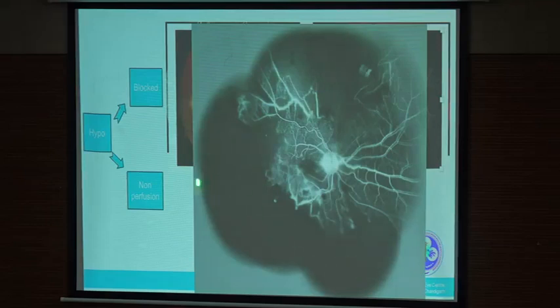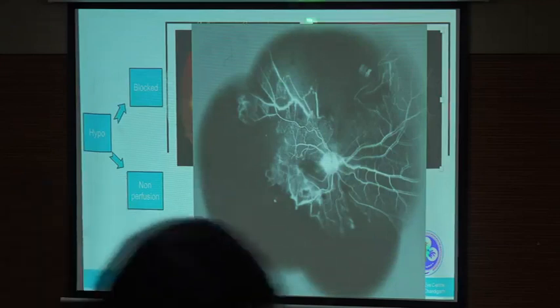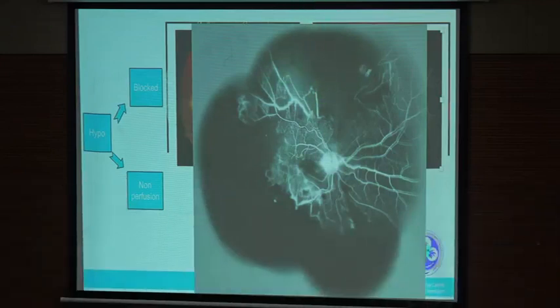So if you say, sir, this non-perfusion is also the same as block, no, look at this one. This is much lighter. All right. So even if I don't have a clinical picture here, this is due to the non-perfusion. Why non-perfusion? Suddenly these arteries and veins have their path stopped by something, inflammatory mediators or thrombus or whatever the etiology is, and it is not letting the blood go there. It is called the non-perfusion. So if there is no blood in the clinical photograph, this is a non-perfusion because the blood is not able to go. So you will call it a problem with the artery and the vein.